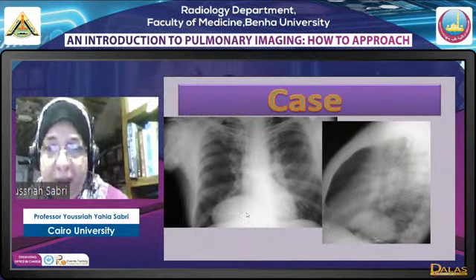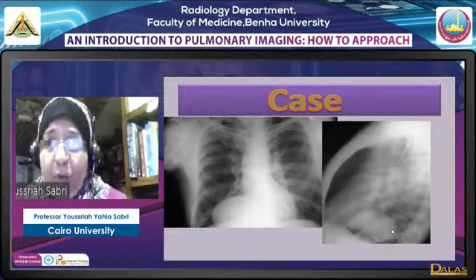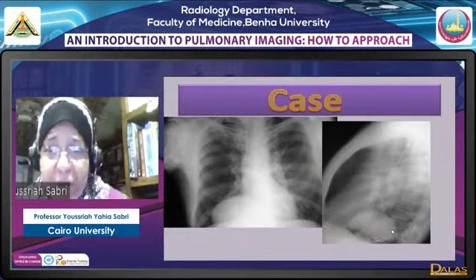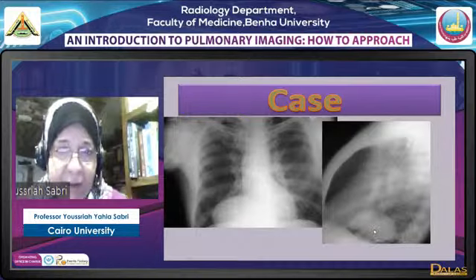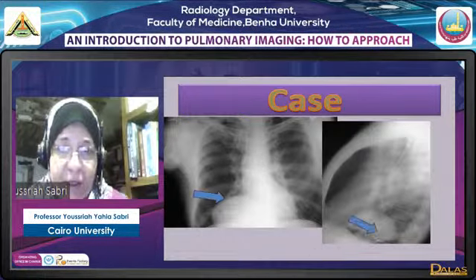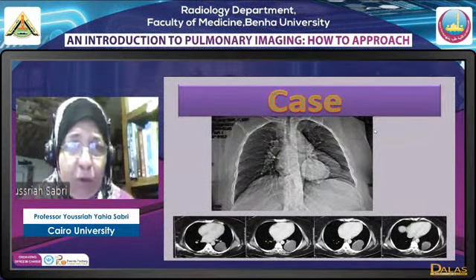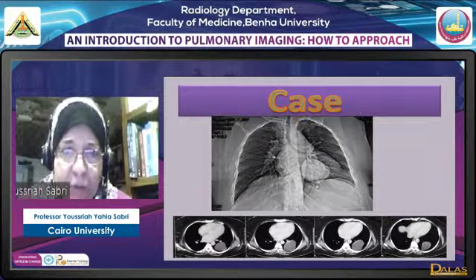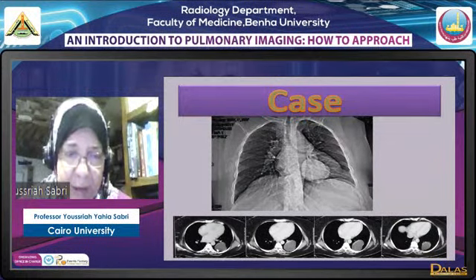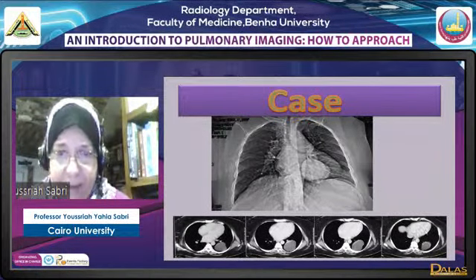Once we see a lesion of this size, it is benign looking, and not only that, it raises the possibility that I'm dealing with a cyst, a fluid-containing cyst. A smooth large lesion with an outline like this. This was actually a case of solitary hydatid cyst. Another case confirms this: a female patient in her 7th decade. Look here, a very well-defined, smooth, large mass lesion. On tissue characterization it is totally fluid content. Again, a case of hydatid.